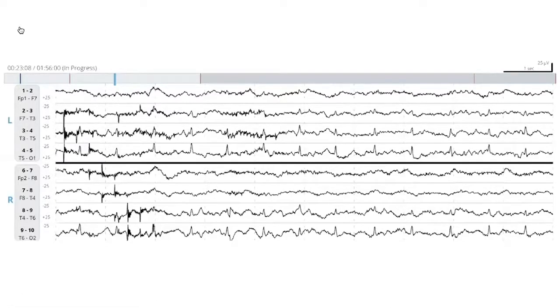It's basically every time the heart is beating, the blood is pumping through the carotid arteries, especially in patients with a very thick neck or short neck, or depending on the way that they are lying, you'll see this type of EKG artifact, and it's nothing specific to Ceribell.